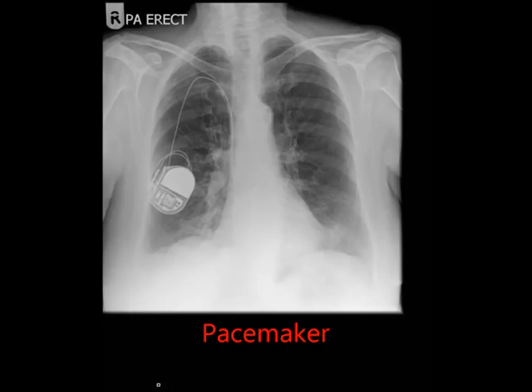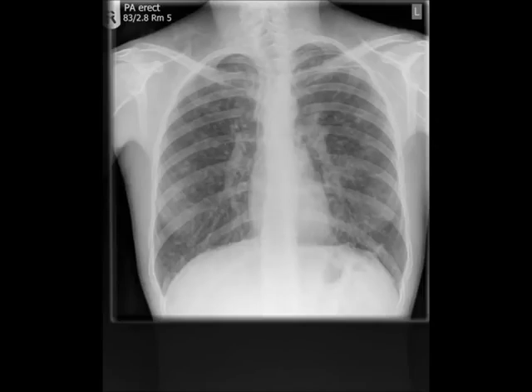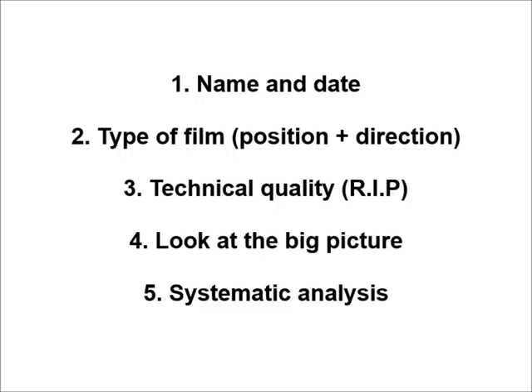Instruments refers to all those things doctors like to put onto or into patients. So we're talking pads, wires, cables, tubes, etc., etc. Sometimes it's obvious what you're looking at, sometimes it's not. So if you don't know what it is, don't worry about it and don't spend too much time trying to figure it out.